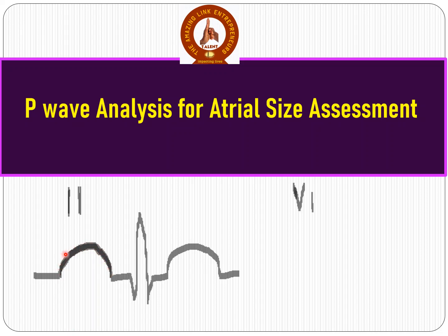It's upright, monophasic, and it has a rounded contour. This shape is a sum of the wave of atrial depolarization, which consists of right atrial depolarization and left atrial depolarization waves. As such, we can examine the components of this configuration.